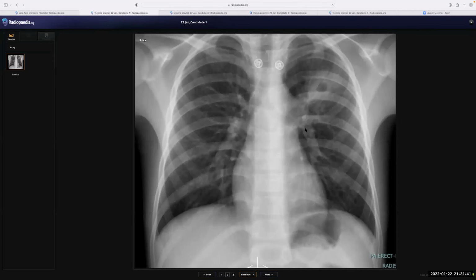This patient, you are right to suspect either cavitating pneumonia or TB. This child did come from a rural area endemic in TB, so this was a case of TB. Please don't forget to mention that you need to isolate the patient at least until we know the result of the sputum analysis, if he's TB or not. Yeah. Okay. But otherwise it's fine.